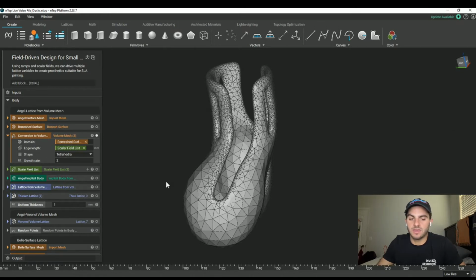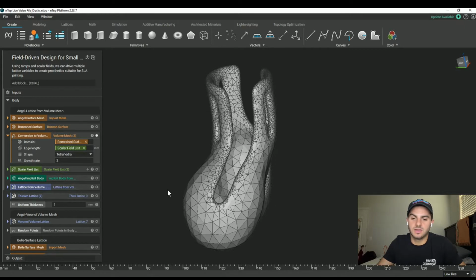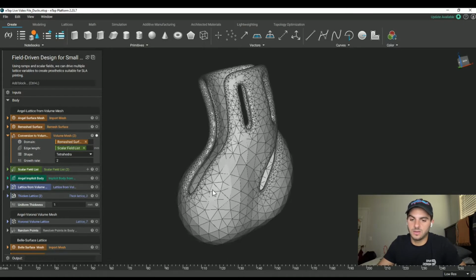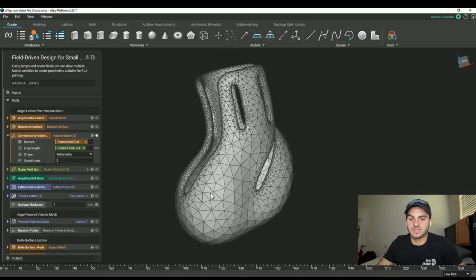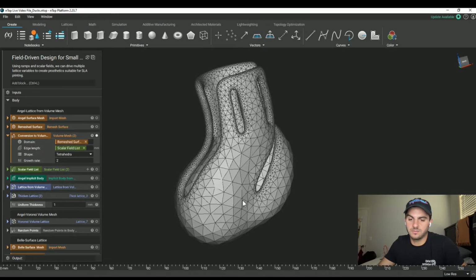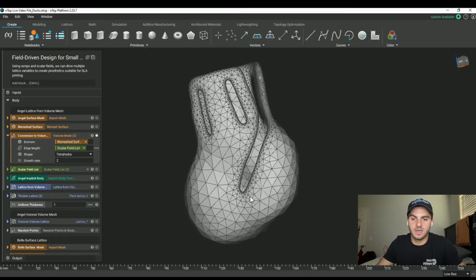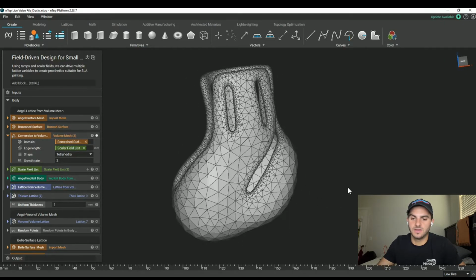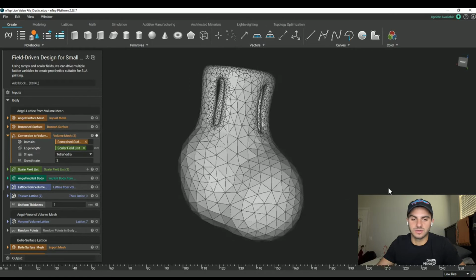If you take it back to a basic physics class, scalar fields versus vector fields, right? A vector is something with a magnitude and direction, whereas a scalar just has a magnitude. So it's basically the same idea here. nTopology is a math based software, so it's going to use a lot of those concepts you learned back in your early years of school, at least for me in engineering school, right?